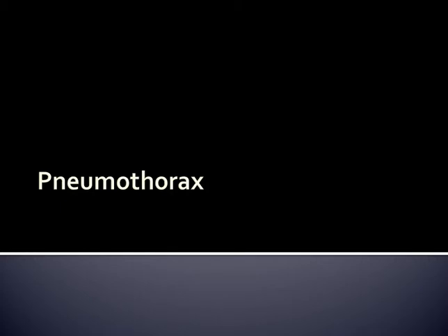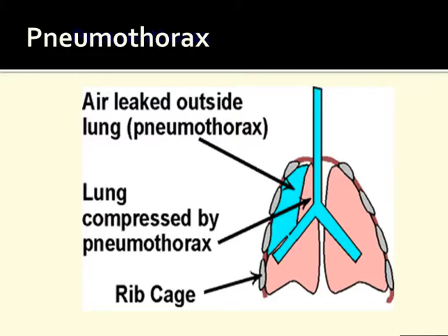So this is a short screencast on pneumothoraces in relation to the pathology recognition series for the PRP module. Now, a pneumothorax is defined as air that has leaked between the pleura, so it sits within the chest wall cavity, and as you can see, it's defined as this area of air here.